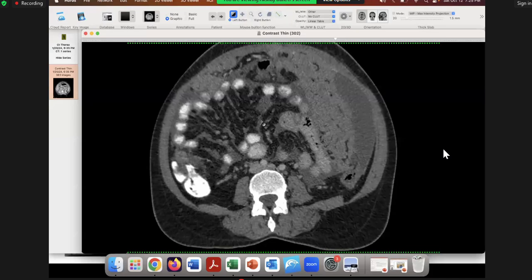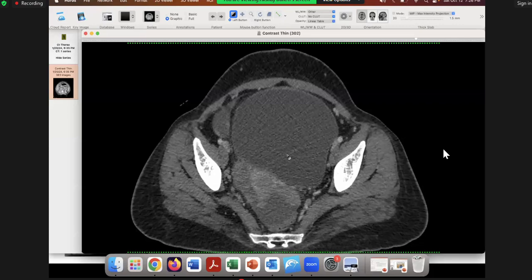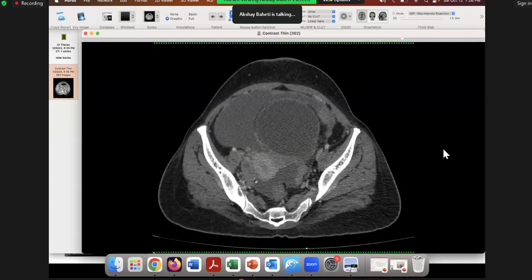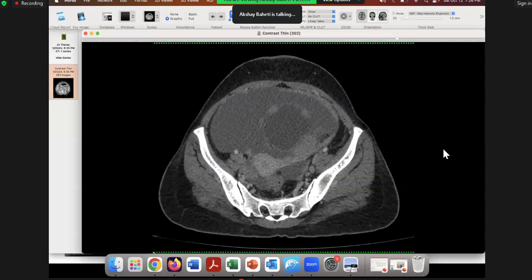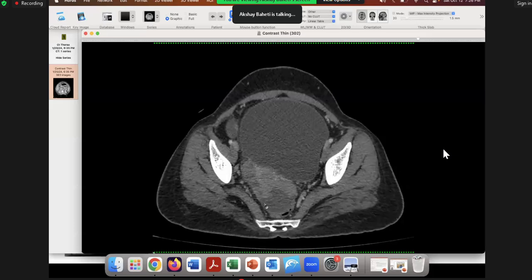Yes. So this is one thing you have to again mention. Okay. Then of course you go down, and of course we haven't really gone to the ovaries as yet. But the adnexa are abnormal, but it's not huge masses, isn't it? So there's one here, and there's something here as well. And the most dependent position is going to be POD, pouch of Douglas.